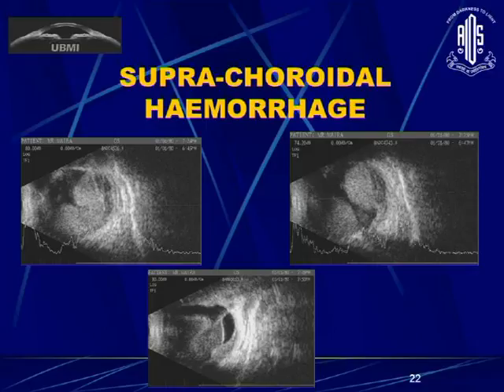There was an associated amount of vitreous hemorrhage, which looked like a mass on the earlier scan. And then he again vanished and said, I don't want to do anything, I'm absolutely fine. Came after 1 year. You see the suprachoroidals have already gone. It's developed as a vitreous hemorrhage with a PVD attached to here.